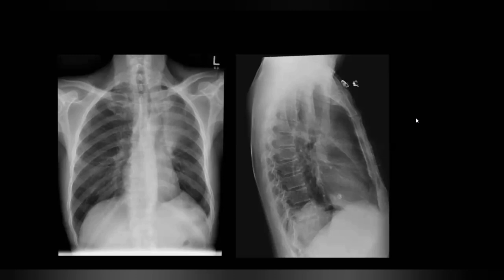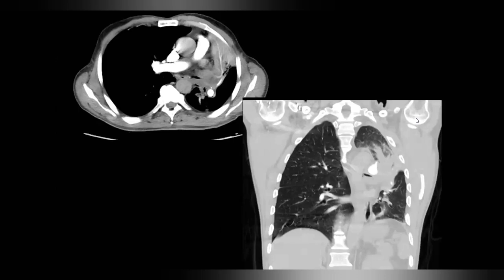Yeah. So here I would say that I would do a CT scan, which is totally perfect, and I will add that I will also contact the referring physician to inform him about this important finding, because the patient may go and not come back, and so you save the life of the patient. And the CT scan clearly shows that the central mass tends to be bronchogenic carcinoma, and there's an obstructive mass and underlying associated lobar collapse.